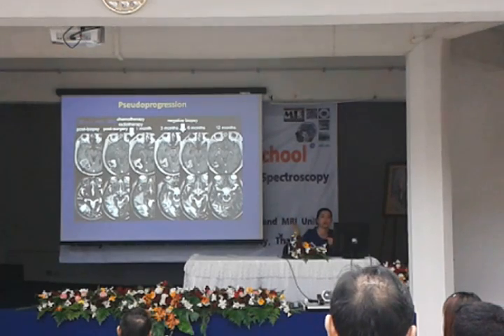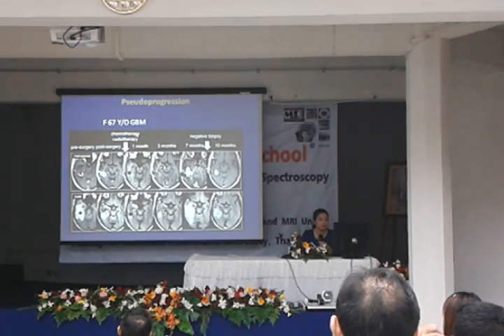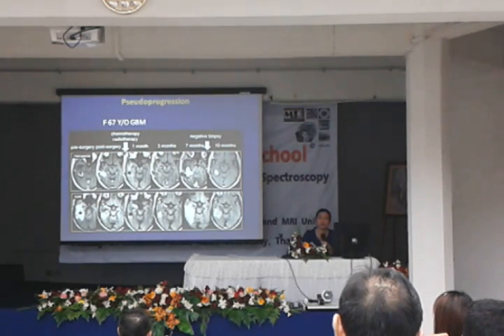That's the time when advanced imaging is needed to help. And in this one again, the tumor gets smaller, and after that gets bigger, and biopsy is negative. This is called pseudoprogression, from the chemotherapy effect. It's not a recurrent tumor. The radiologist needs to know this condition.